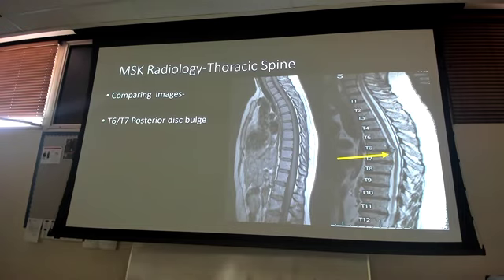If I were to give you something like this and I wanted you to pick it out, I could not give you T10 and 11 and T11 and 12 as a choice, along with T6, T7, because technically all three are there. So if I gave you this image, I would have only one choice that is absolutely correct, and the other four would be things like T3, T4, T4, T5, T8, T9, ones where there aren't any.